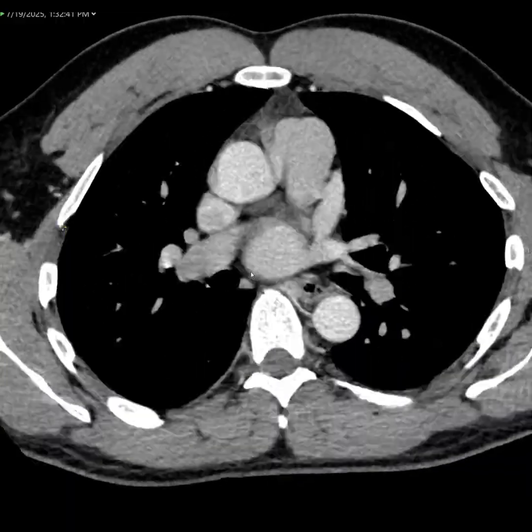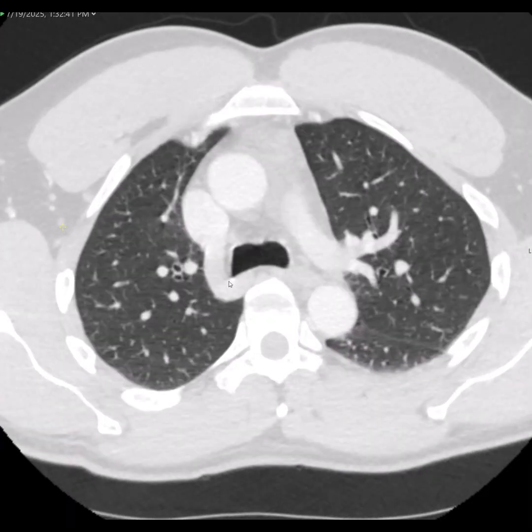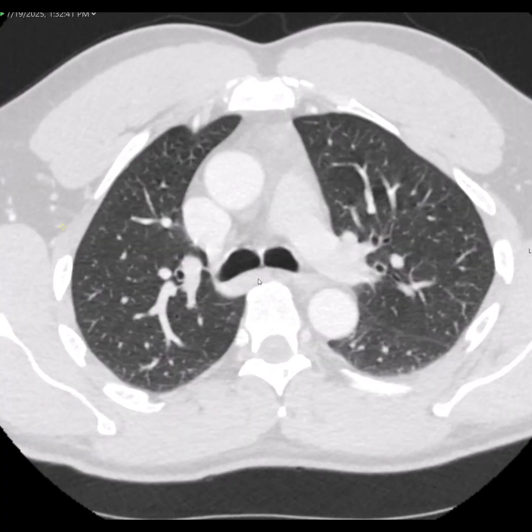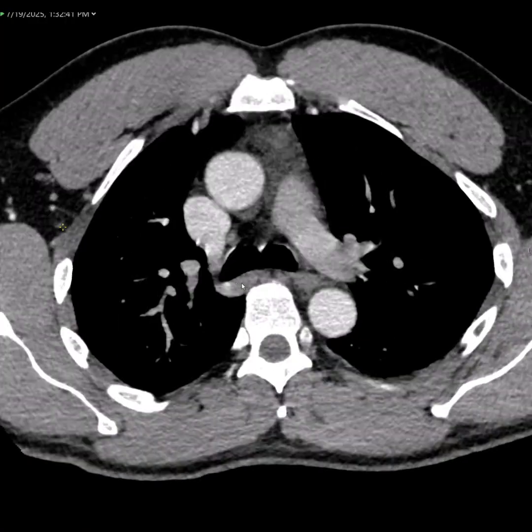Be careful not to mistake any of your typical findings in the mediastinum for lymph nodes, such as the esophagus or the azygos vein. Here you can see the azygos vein coursing, not just appearing as one enlarged soft tissue density in one slice, but coursing into the SVC.